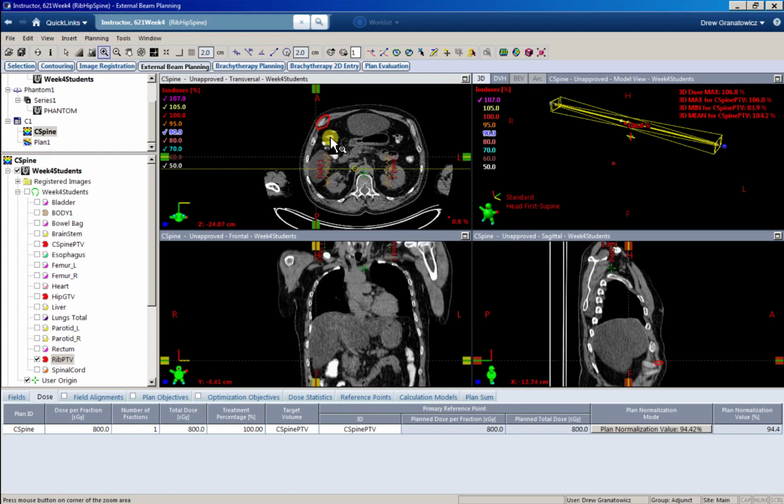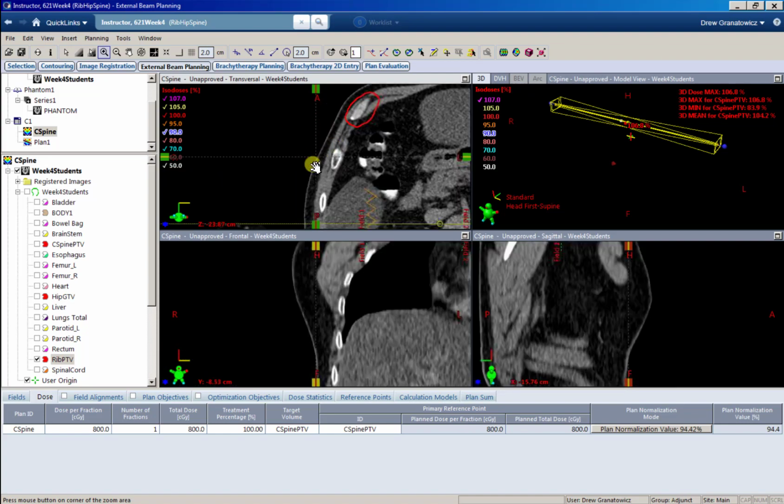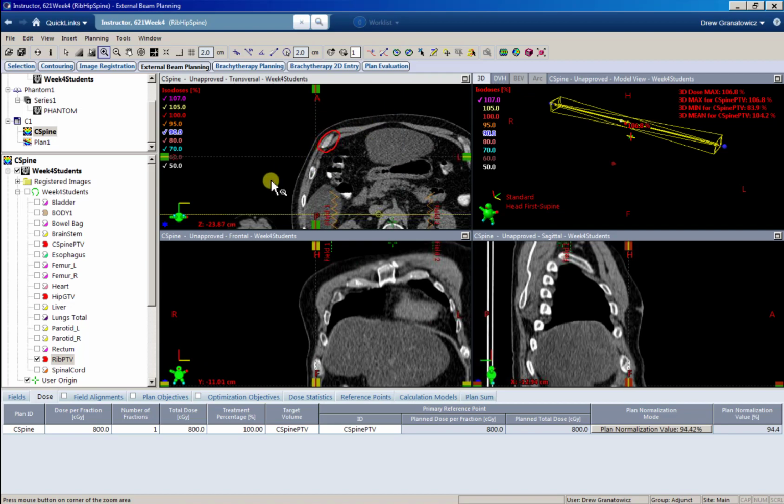Usually you can just throw a beam on and start experimenting, but if you just look at this, APPA is not going to be a good idea, right? If we used APPA, we would be treating through this big chunk of body, and we'd be hitting a good portion of the liver with some bowel, the kidney. Definitely don't want to do APPA for this type of case. What would make more sense, right, is if we went in at more of a tangential angle.